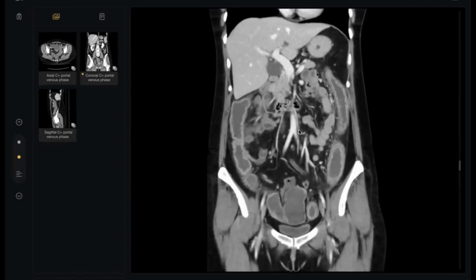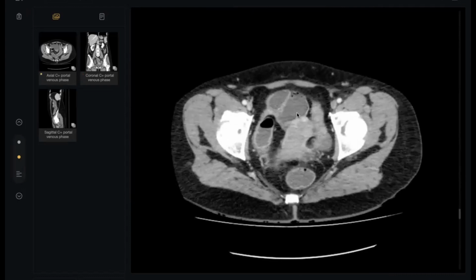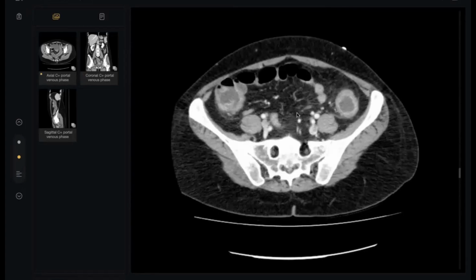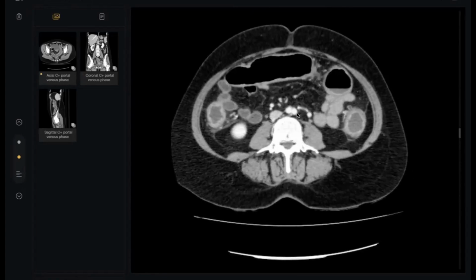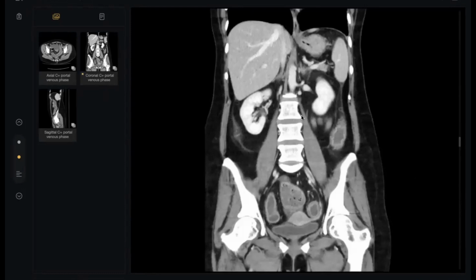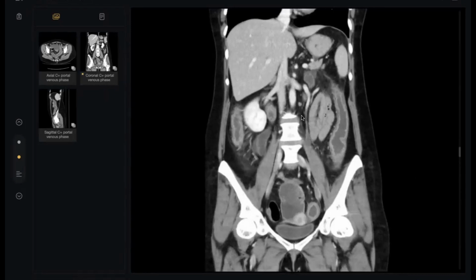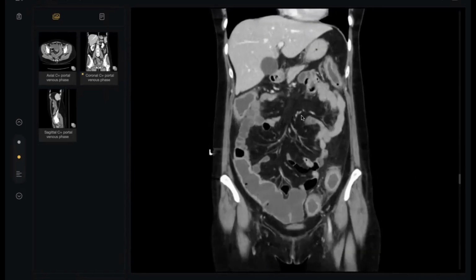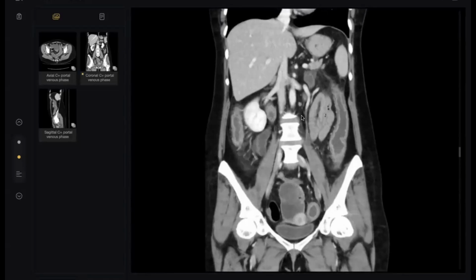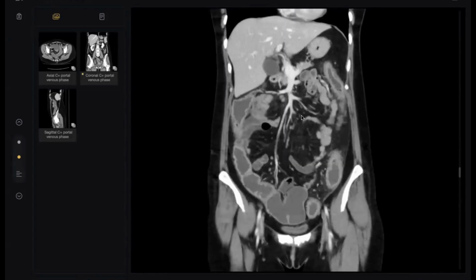I think on the CT here there is no obvious clue to exclude one of them, because the inflammation here is extensive and causes obvious significant mural thickening and enhancement. It gives a little bit of a lead pipe appearance maybe, but it is better to say, Dr. Roshni, loss of the haustration. Better, because a lead pipe appearance is a sign of chronic ulcerative colitis, and actually we are not sure about the diagnosis here. There is no clue why the sacroiliac joint is normal.